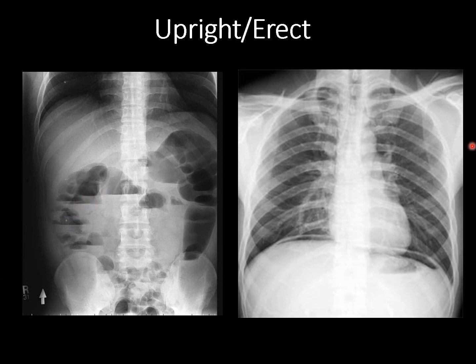And then on the right side of the screen, this is not an abdominal radiograph, but it illustrates the same concept very well. Again, this is upright, so air will go antidependently. Any fluid, if present, will go dependently with gravity. So we look under the diaphragm here. Because the patient's upright, we're seeing this extra lucency underneath the diaphragm, which indicates that there's free air in the peritoneal cavity. If this patient wasn't upright, this air wouldn't have floated upwards to be below the diaphragm, and we wouldn't be seeing this line, and you wouldn't get as accurate of a diagnosis of pneumoperitoneum.